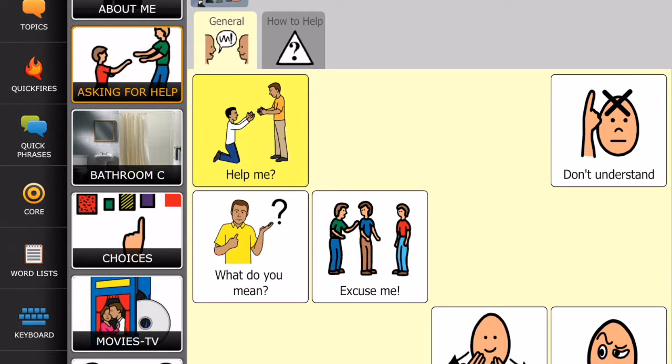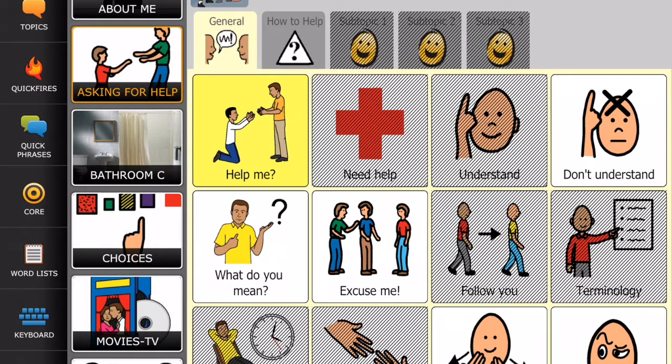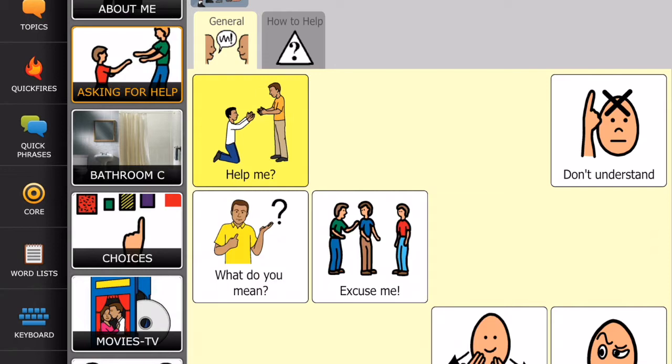One thing I didn't like about the program was you don't have the ability to edit multiple buttons at one time. So if I click the editing feature, I can only click one button and it brings me back to the screen. Some other AAC device applications I've worked with, you can highlight multiple buttons and color code them all, or change the border, or change the font, and you don't have to do one at a time. So that was something that I didn't like about the program.